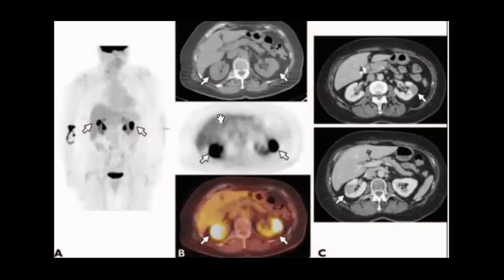Maybe, but as you know, it is not very typical for a scalp sarcoma or any sarcoma to metastasize to the kidney itself, right? So would you like to take a biopsy in this case? Will it be your next step to take a biopsy?